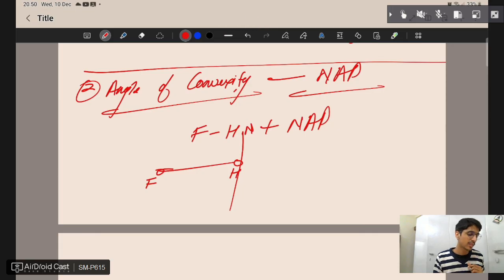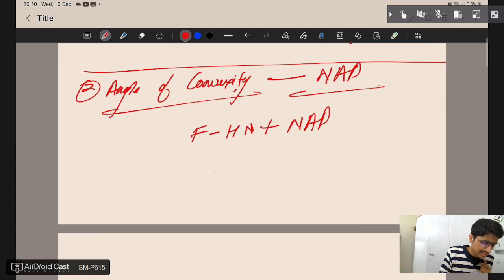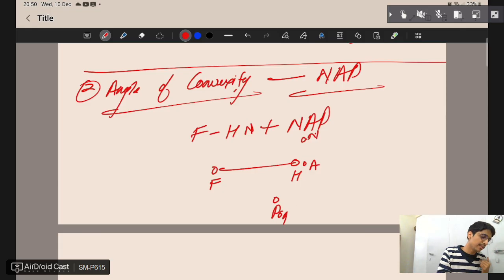So this is the FH plane. This is N point. This is A point. This can be in line with that, but definitely the Pogonion point will lag behind the A point. See, guys, like this. This is a normal class 2 situation.